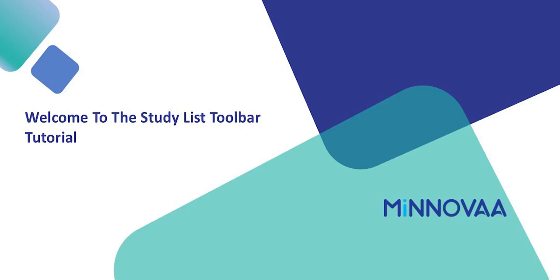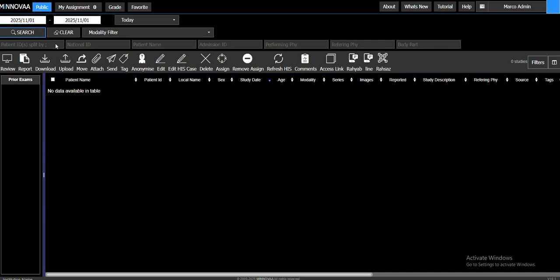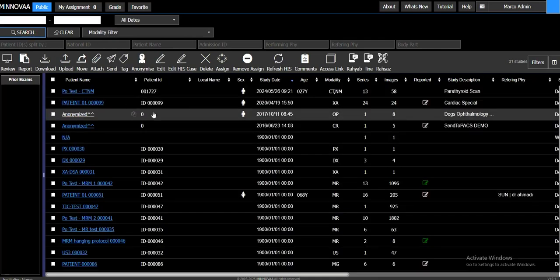Welcome to this course about the study list toolbars. We'll cover understanding the main options in the study list and how to use the available tools within the study list. Studies list. After applying your preferred filters and performing a search, a list of patients will be displayed.